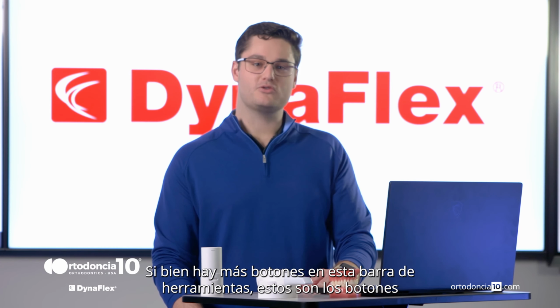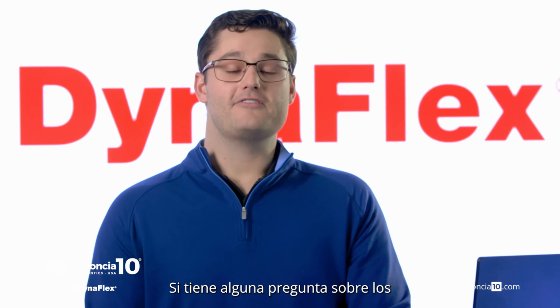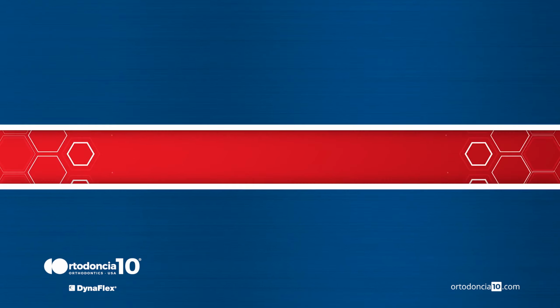While there are more buttons in this toolbar, these are the most important buttons for your practice to use right from the start. If you have any questions on the other buttons, feel free to reach out, and I'm more than happy to help.